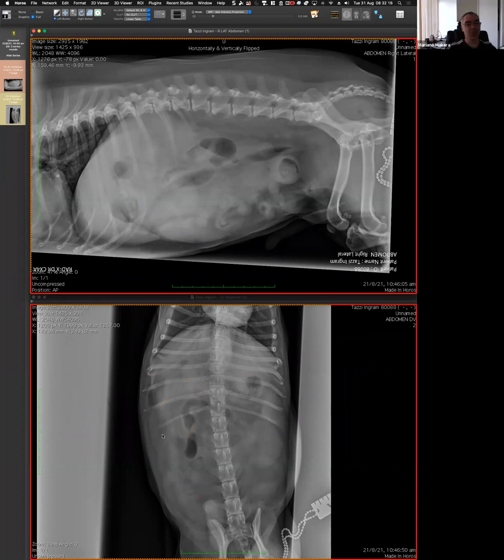Cool. Any other hypotheses? I'll probably try to, there is probably enough of me being quiet and not, let's say, solving the puzzle, but I want to give you the opportunity, because you move forward. So in the beginning you didn't see the structure, then you saw the structure, and then we went to the small bowel, and then we are still struggling with the connections and what is abnormal. I can solve the puzzle, but I'm also happy to give you the opportunity to move it forward.